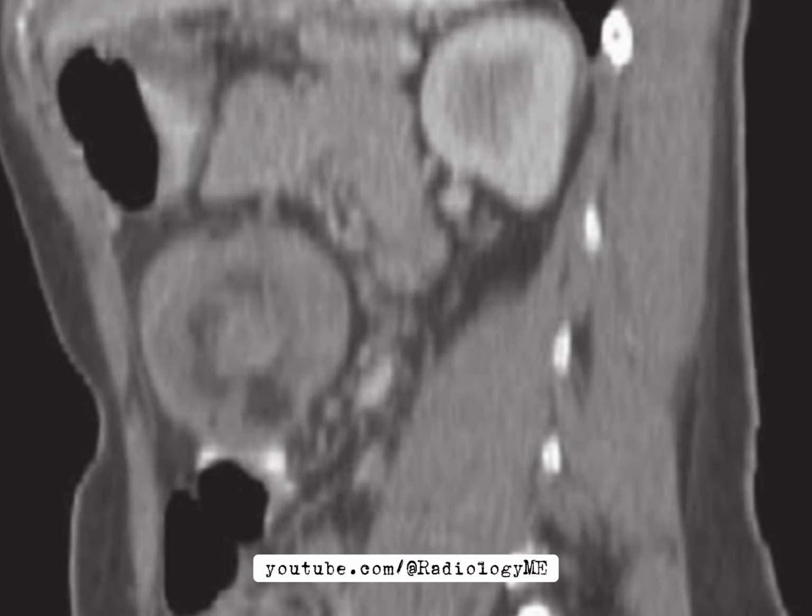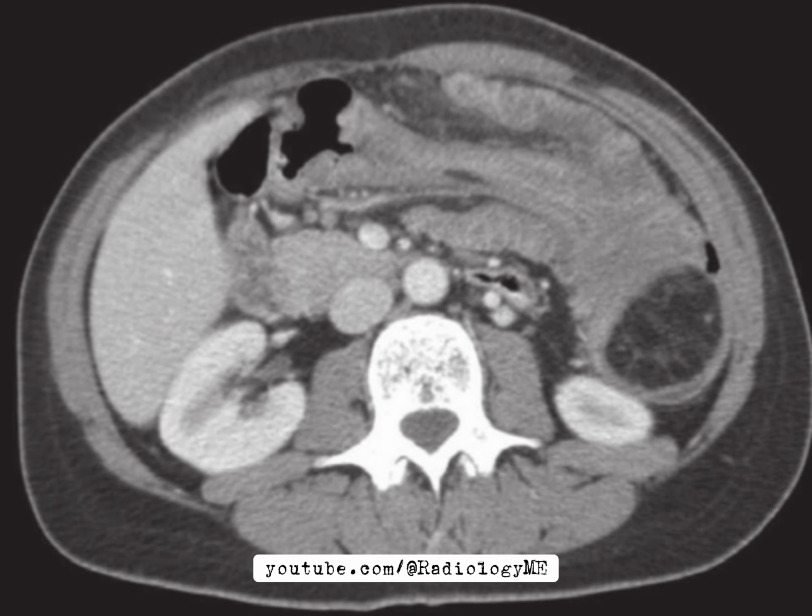Now, diving into the imaging findings, there's a smooth lesion of about 4 centimeters in diameter with fat attenuation in the small bowel. It's showing a characteristic targetoid appearance on the sagittal image. This particular appearance is quite classic and suggests that we are dealing with an intussusception, specifically involving the small bowel. And importantly, there's no evidence of large or small bowel dilatation, no free gas, and no free fluid seen, which are key factors in ruling out complications like perforation or significant ischemia at this point.